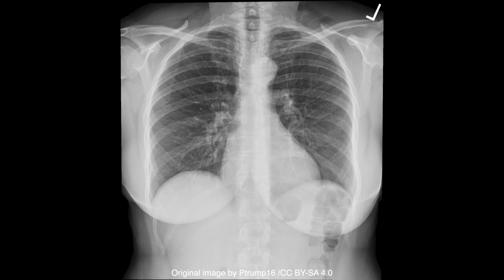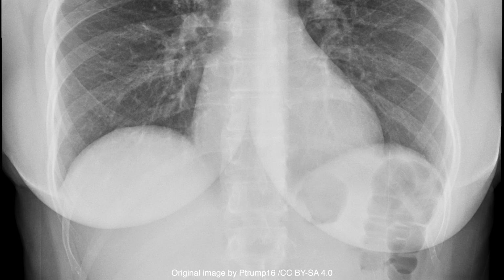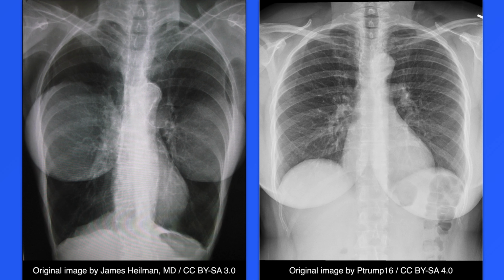Now this is a chest X-ray with normal breast tissue. Compare the radiographic appearance of cosmetic breast implants with normal breast tissue.